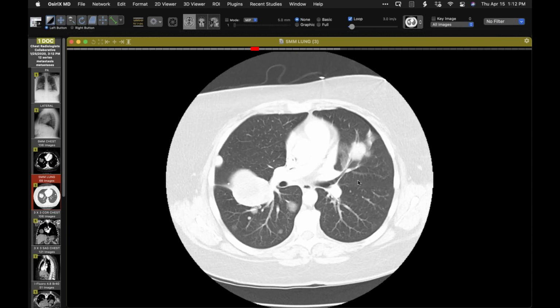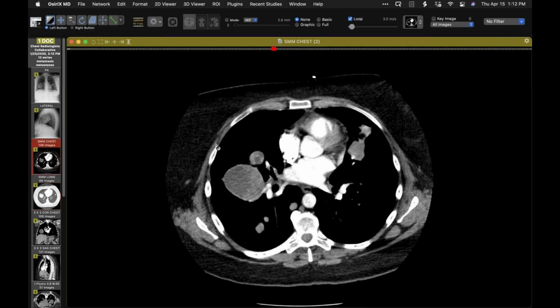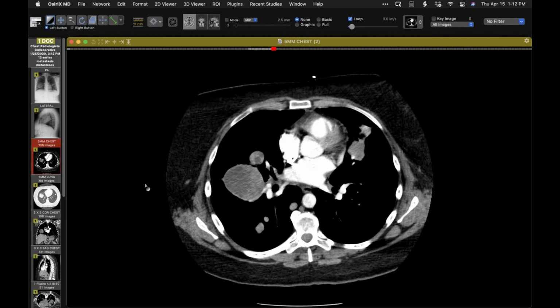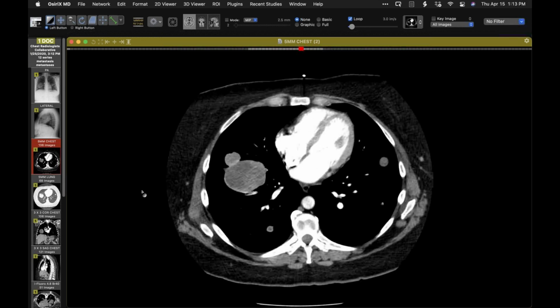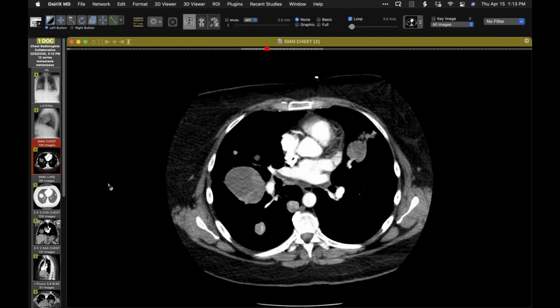This one is interesting in terms of the pathology. So here is a lady with multiple pulmonary opacities, nodular metastases, opacities of different sizes consistent with, in this context, metastases, and quite large over here. Here is CT.